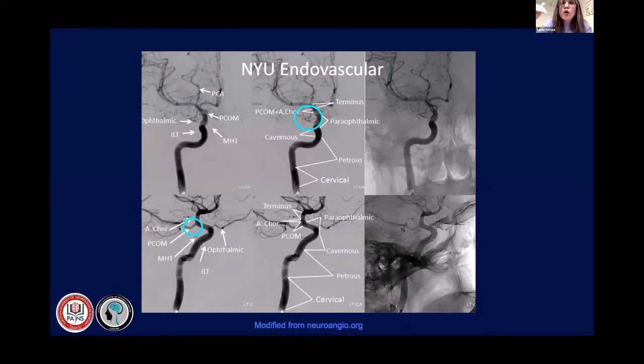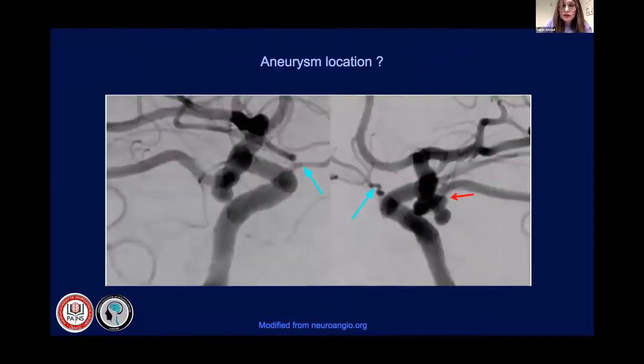So always and always identify the ophthalmic artery and the aneurysms in the lateral angiogram. That helps you a lot. So this is the typical one. You see, again, I put the marks on the ophthalmic artery, because that gives you the clue that this is the ophthalmic artery, opposite this is the posterior communicating artery, and here there is an aneurysm and it is posterolaterally directed.